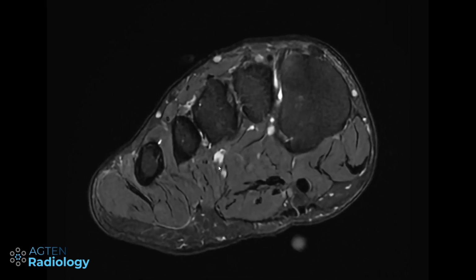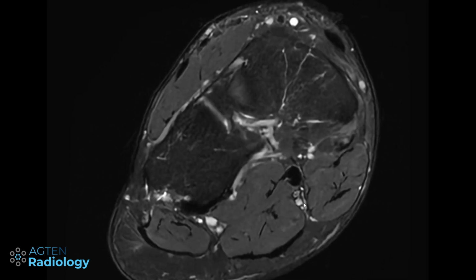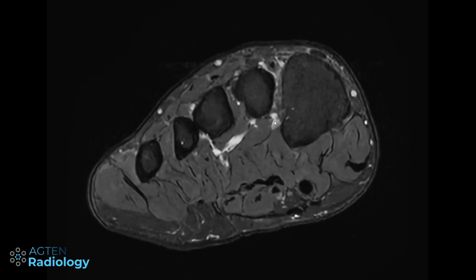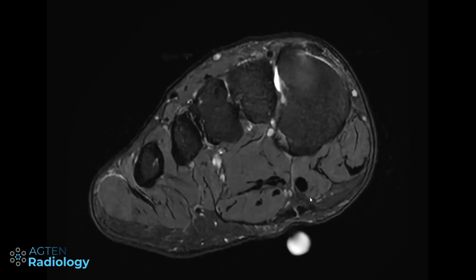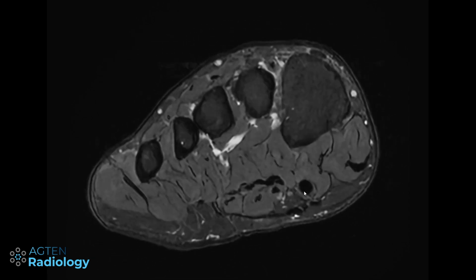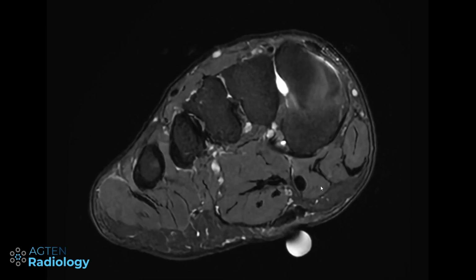You can see it, they go in, they blend in here. It's like plantar arch, lateral plantar vein, medial one, and the medial one here is kind of not nicely going into this. So it's not really a great illustration. We see some problem here with the plantar fascia, but just to keep in mind that there is some variability happening. So now that we know the anatomy, it's important also to know what to look for.